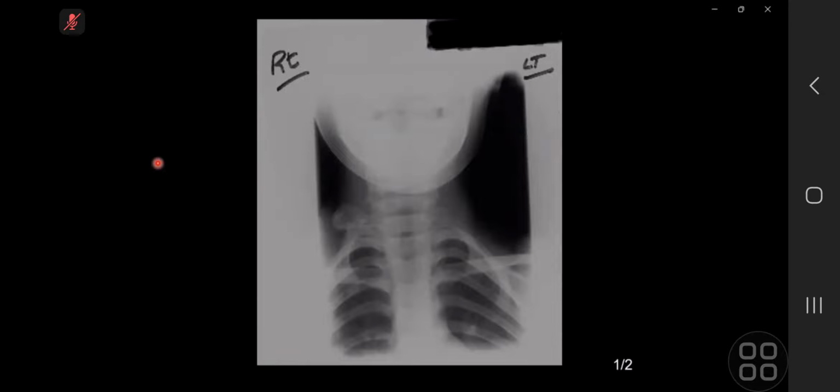Okay, so this is the frontal radiograph of the cervical spine and upper chest. There is a well-defined calcific density adjacent to the right 7th vertebra. It's well-defined and doesn't appear to be separate from the vertebra.